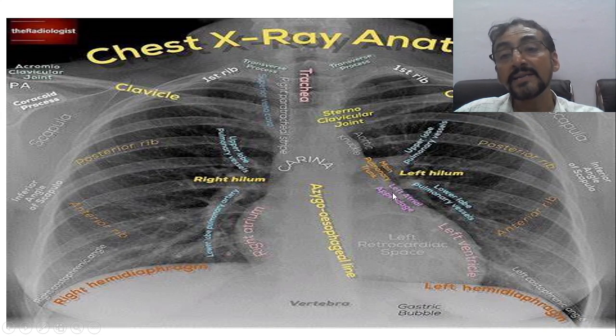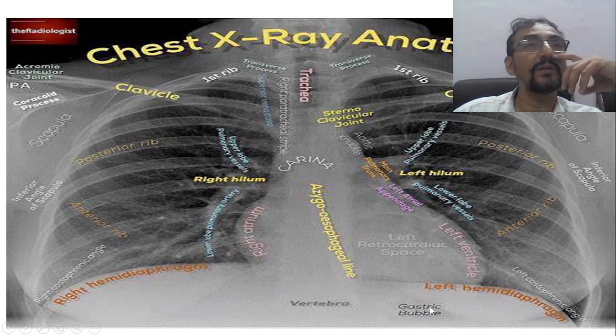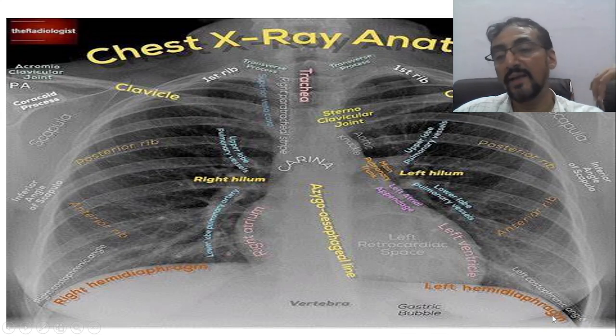ओके. नेक्स्ट कम्स लेफ्ट एट्रियल अपेंडेज. इसके बाद जो ये स्लोप शुरू हो गया, व्हेन द स्लोप इज स्टार्टेड, दिस इज अ पोर्शन ऑफ लेफ्ट एट्रियल अपेंडेज, एंड दिस इज द लेफ्ट वेंट्रिकल, एंड दिस इज लेफ्ट कॉस्टोफ्रेनिक एंगल. दिस इज लेफ्ट कार्डियोफ्रेनिक एंगल, सॉरी, दिस इज लेफ्ट कार्डियोफ्रेनिक एंगल. एंड हियर देयर विल बी अ bubble that is called as gastric bubble, indicating the stomach gas.